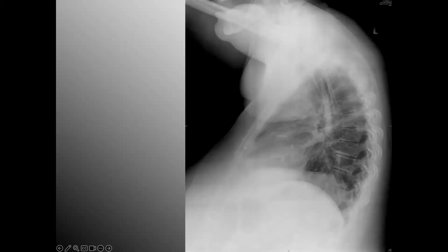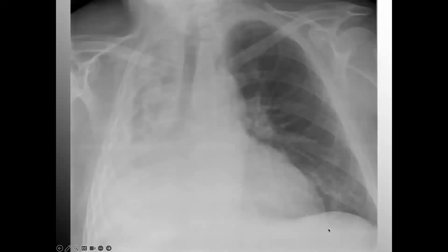So I do assume, because I had the frontal view, that that has to be the right, and it happens to be the one that's more flat. I can see a clearly delineated sulcus here, and I kind of lose it in this general area. This is where all the fluid is located. Can you tell? I may have to darken the lights in the room there, but can you tell there is a greater density here? There's more radio opacity in this area, and that's where the effusion is located. Just takes a little practice.